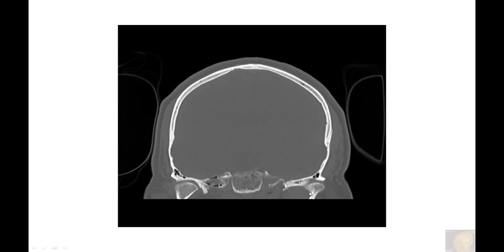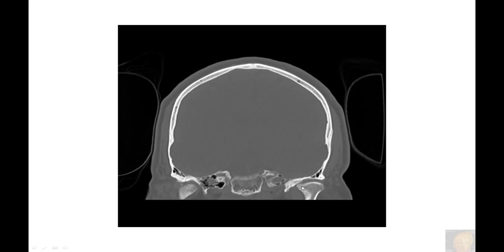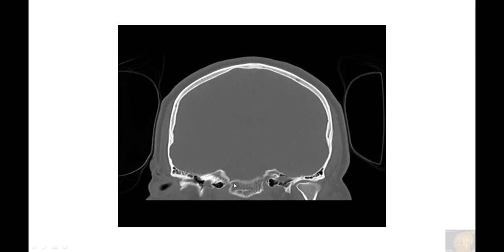And moving more posteriorly, here are the bilateral temporomandibular joints. They are involved in moving our jaw, talking and eating, and if you have pain there, you cannot open your jaw well without pain. And this hole is for the internal carotid artery that supplies the brain. Same thing here. It's called foramen lacerum.